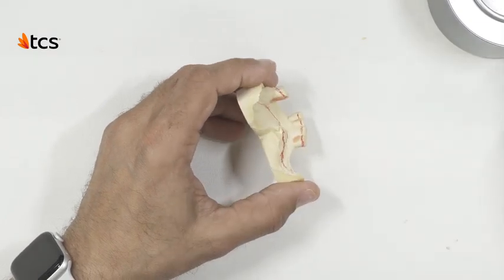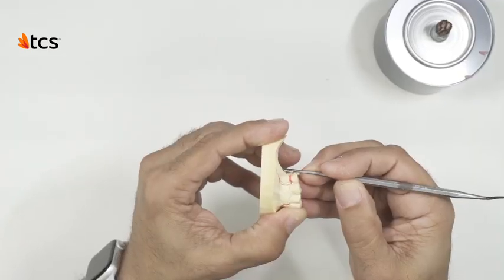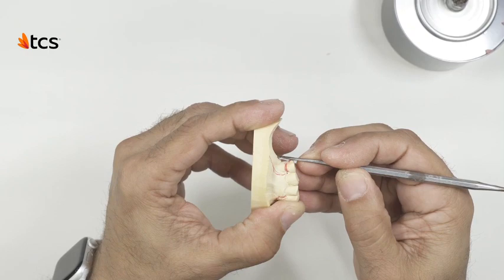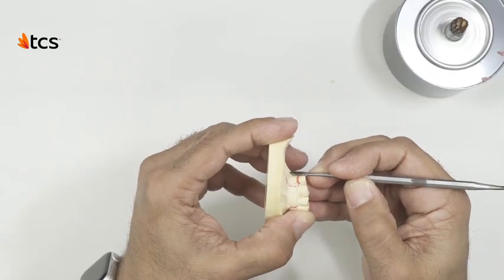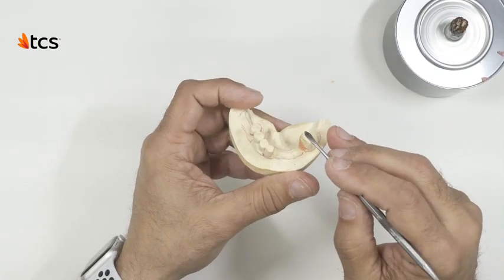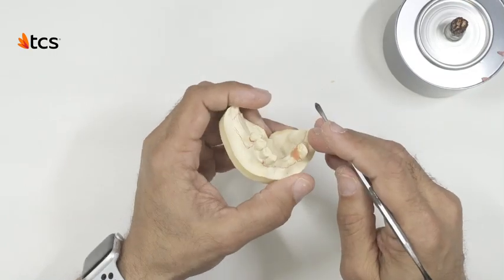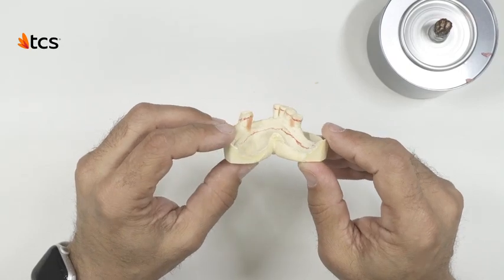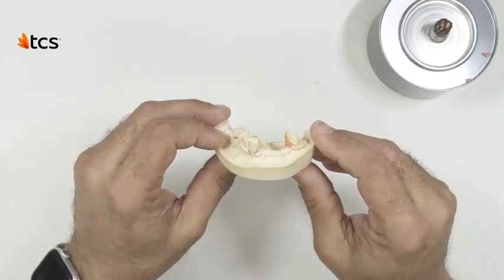When blocking out free end saddles, keep in mind to avoid relieving 100% distally. If the undercut is minimal, it is best to leave unblocked to have retentive control in the fitting stage. For instance, this area will remain unblocked considering this premolar is compromised with a parallel blockout and retentive control will be necessary for a precise fit. This case is fully blocked out and is ready to move forward to the duplicating process.